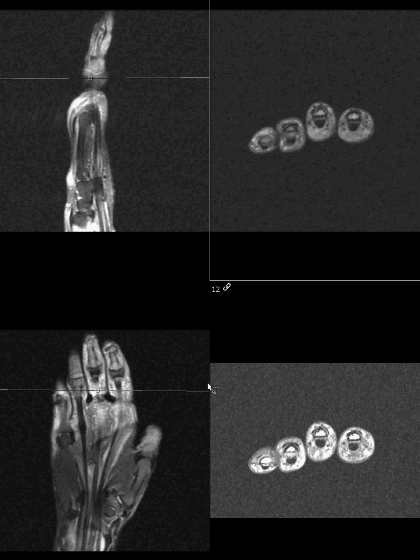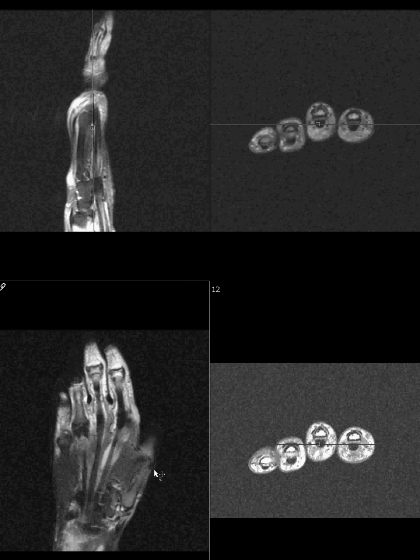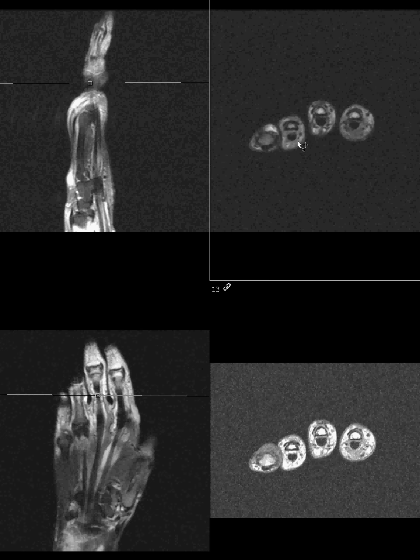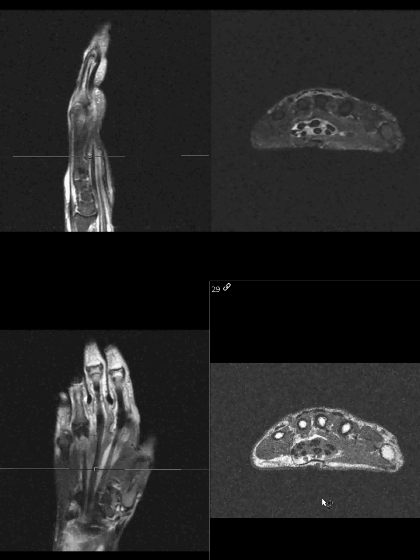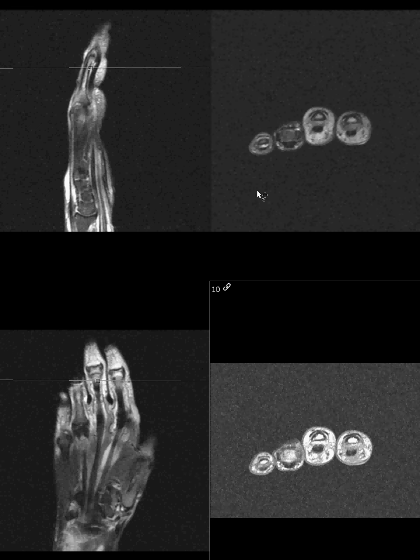So this early on, I think this should have been recognized as bad fat suppression and switched to a STIR. And then imaged this in STIR as well. But instead we have three planes of this poor fat suppression, frequency selective fat suppression, and therefore we have limited information about the bone marrow. We have T1, but that's not nearly as sensitive as the fat suppressed fluid sensitive sequences.